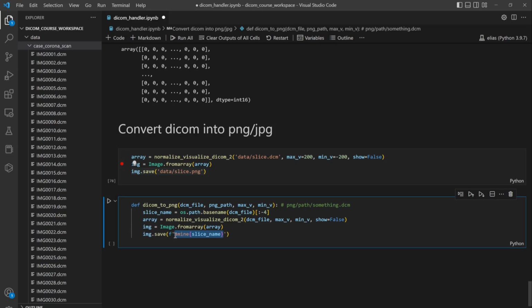And why I am doing this: there are a lot of ways to do this part, but I just like this one. It looks a little bit fancy, but it is one of the 3 or 4 ways to do the same thing, to create the paths.